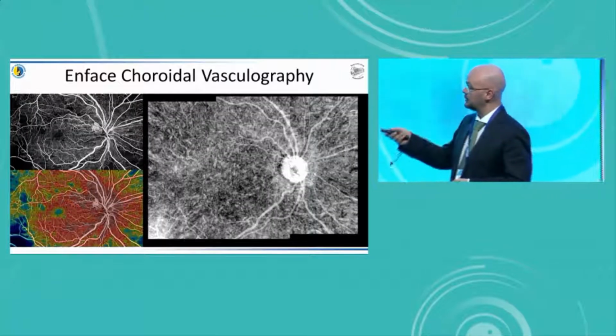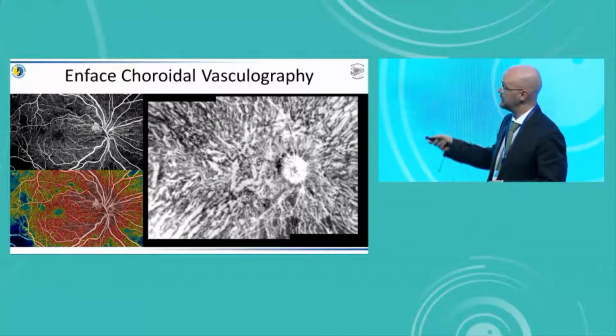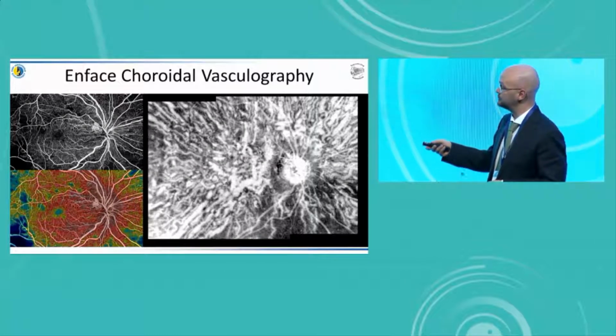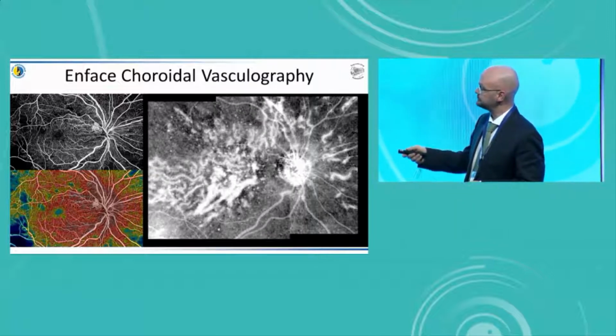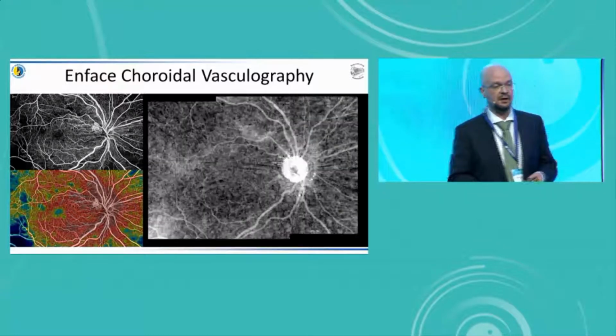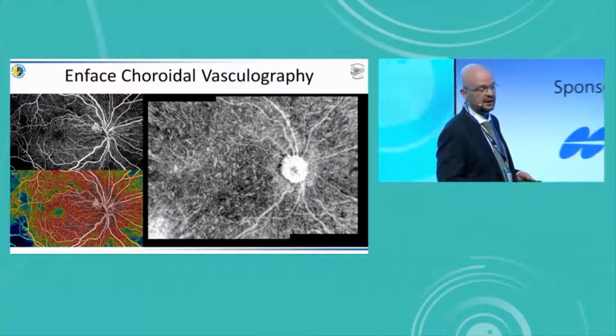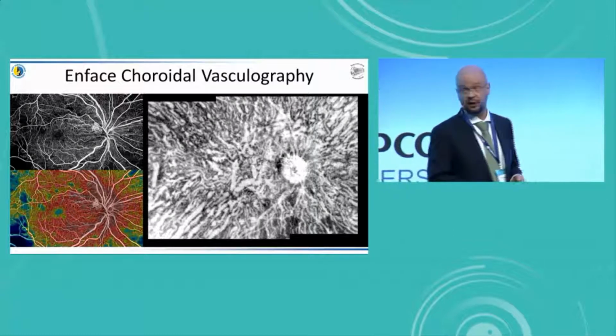So I took this proliferative diabetic retinopathy, and I did a fly-through that goes through the entire scan one by one. And you can see that this is truly able to visualize the choroidal structures in a way that we weren't able to before.